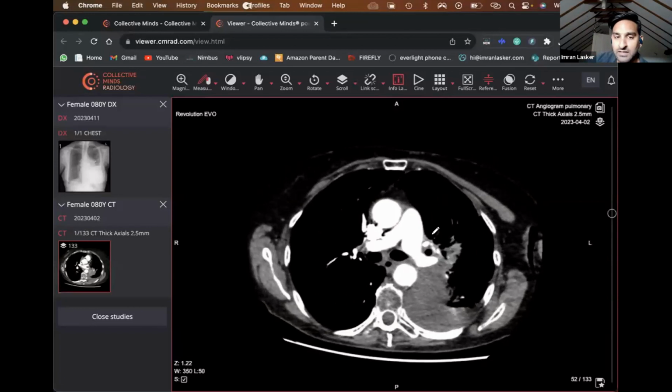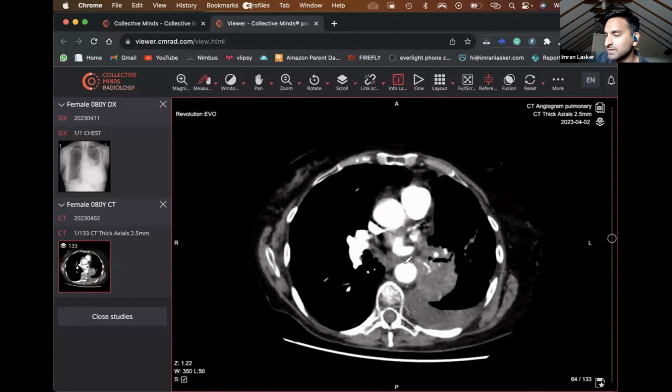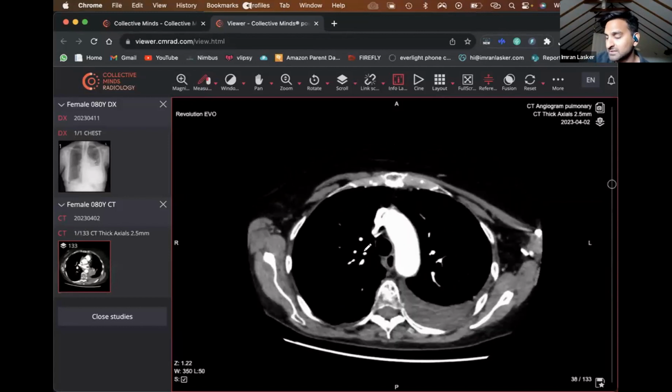So the thing we're worried about now is this patient has clearly got an underlying lung abnormality. They've been smoking. You've got some consolidation, which may be secondary to an underlying malignancy. It could also be because of a concurrent infection, but you've also got what looks like quite a large mass. The next thing with chest imaging is to look for whether there are any lymph nodes anywhere that would suggest this has spread.